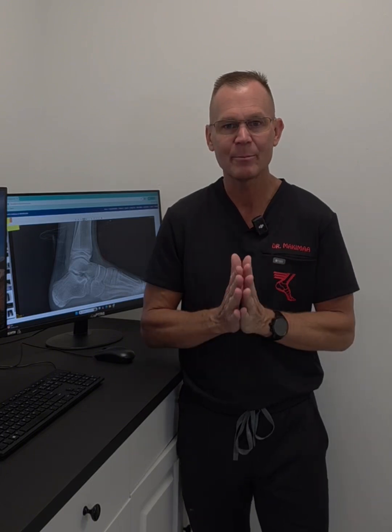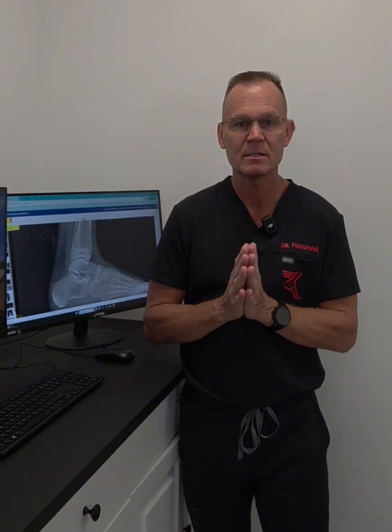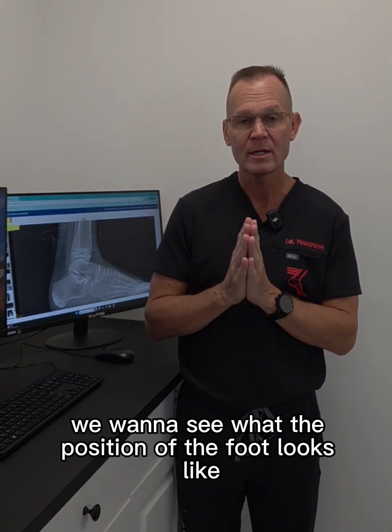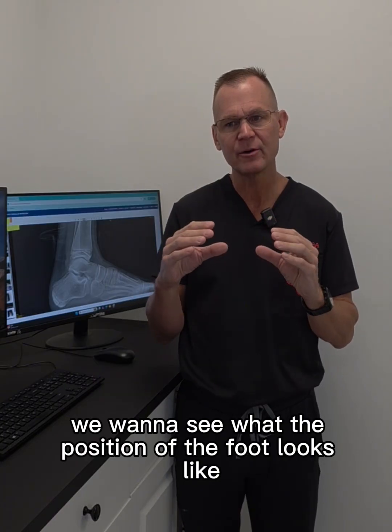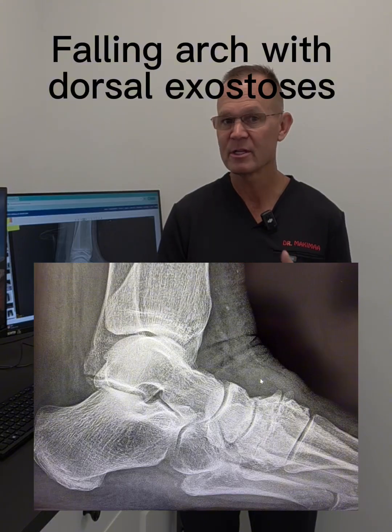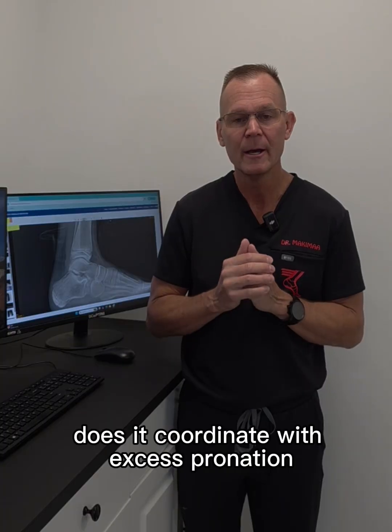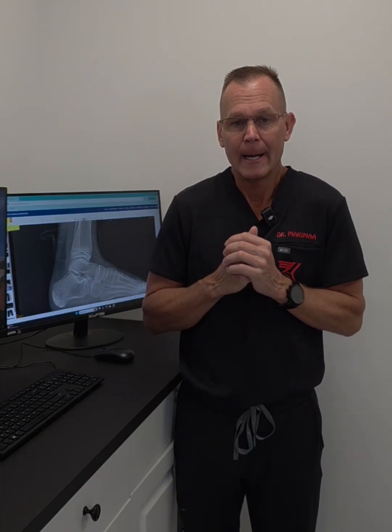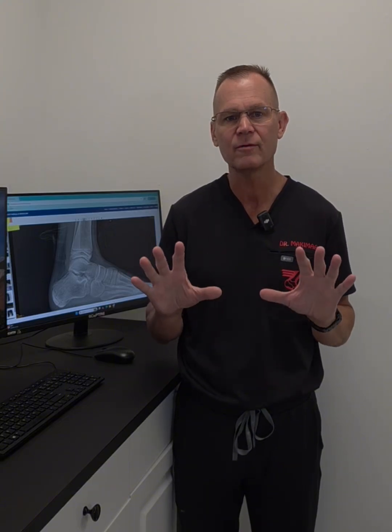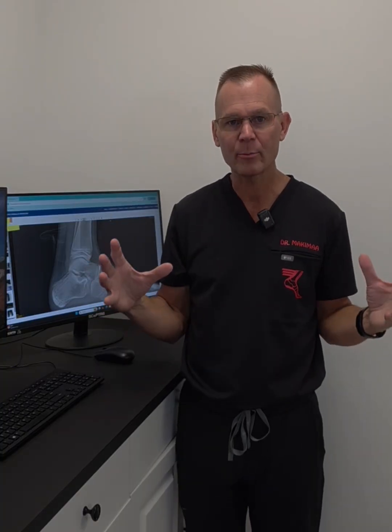I'm going to go through several examples of what to look for on the X-ray, some subtle signs, some obvious signs, but the X-ray is critical that there's a weight-bearing X-ray. We want to see what the position of the foot looks like in a weight-bearing structure, also how the joints are functioning. We want to look for, is there a subtalar coalition? Is there a falling mid-tarsal arch? Does it coordinate with excess pronation? Fracture, tumor, all kinds of things that we're going to look for in X-ray. I'm going to run through a bunch of examples of some things that you'll look for in standard and also non-standard. As again, I want to be all comprehensive in this.